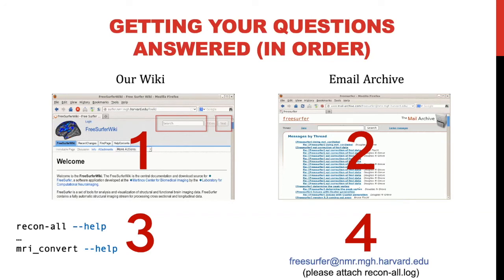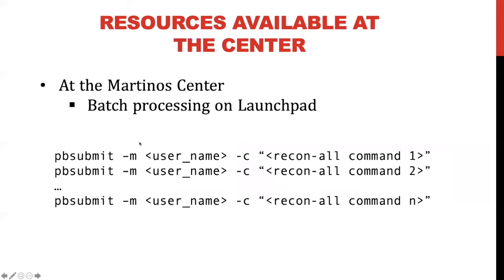Basically, you can either submit multiple command lines to Launchpad, and then you can have 17 subjects running. And that can be super useful for, found it, 10 years later. And so this is super useful in terms of it will give you notifications of if it ran to completion, if it exited, and it'll kind of send it right to your email, which is why you input your username there. And so basically you can just submit multiple of these, and that's how you can batch recon quickly.